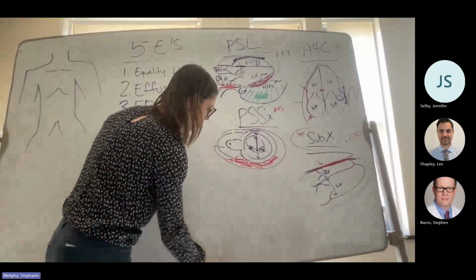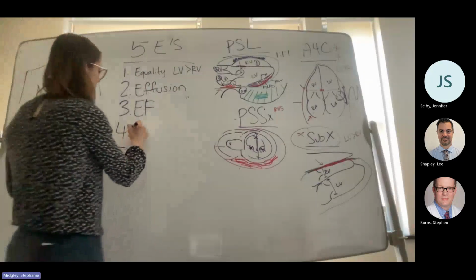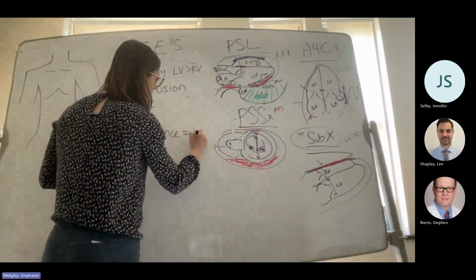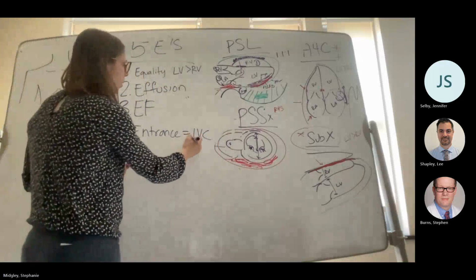All right, so moving on. So those are kind of the top three. The other two are a little sneaky. So there's entrance, which is literally just your IVC, which is kind of just a reminder to look at your IVC.